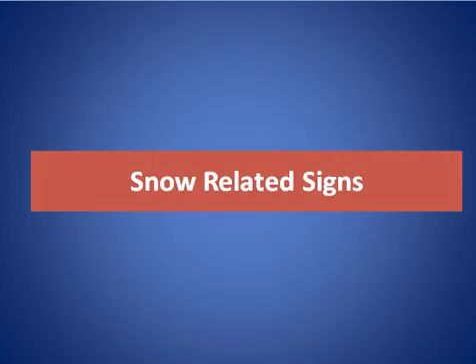My topic today is a short talk about snow-related signs in diagnostic imaging. Here I will discuss the snowman sign and its differential diagnosis and some examples, the snowstorm sign or appearance and some examples, and others related to snow signs.